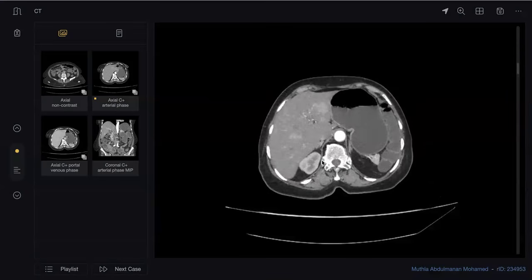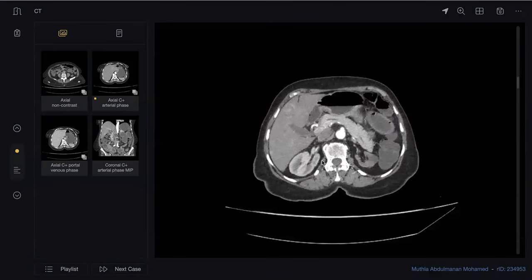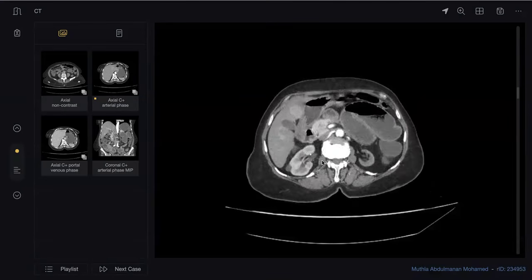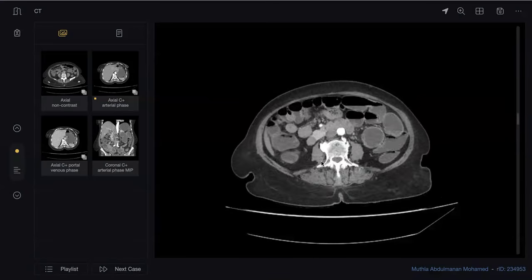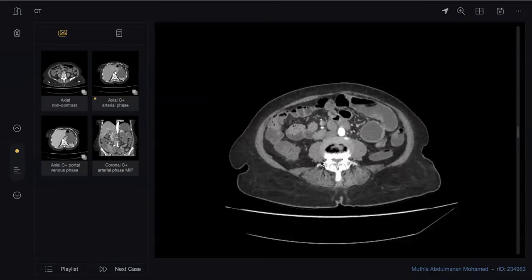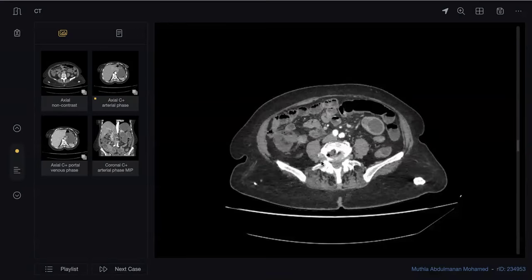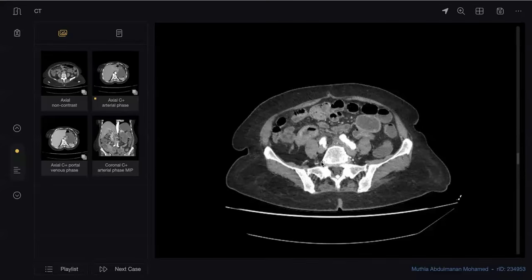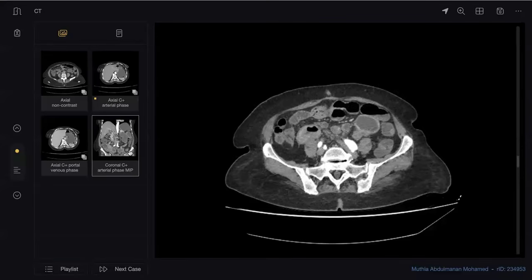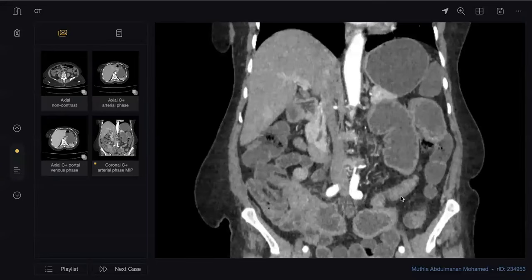I am dealing with a metastatic hypervascular liver lesion secondary to an ascending colon mass lesion. I need to confirm the position of the lesion adequately in coronal study, if available. Yes, you can see the coronal. It is a single image. So go back to the axial contrast.